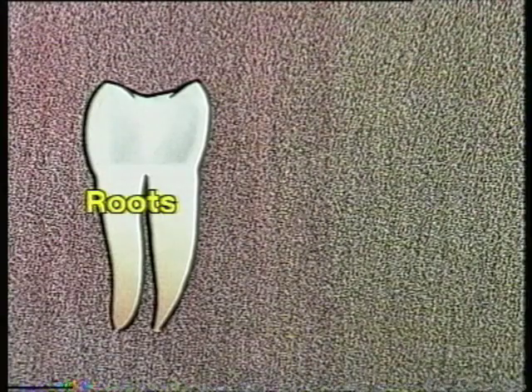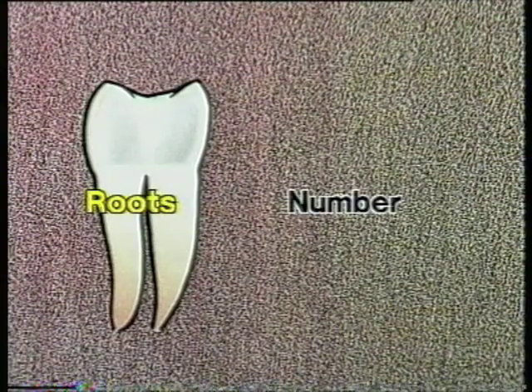Now we should consider the morphology of the roots, and the first factor we need to consider is number. It's most important to look very carefully at the radiograph to determine the number of roots present, and it's essential not to be fooled. I'd like you to look at these X-rays. This one shows a developing third molar in mesioangular impaction. There are no roots as yet formed.